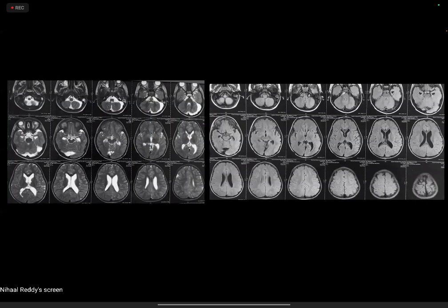Okay. All right. So the initial MRI, there's some degree of ventriculomegaly out here. The posterior fossa extra-axial space, especially on the left convexity, is prominent. That was labeled as retrocerebellar. No signal abnormalities in the basal ganglia, thalami, cortical, subcortical regions, possibly some benign cystic foci, perivascular spaces in the periventricular regions and deep white matter. On FLAIR, no parenchymal signal changes, maybe some degree of periventricular volume reduction with the ventriculomegaly, and the posterior fossa changes predominantly in the extra-axial regions. That was the first MRI.